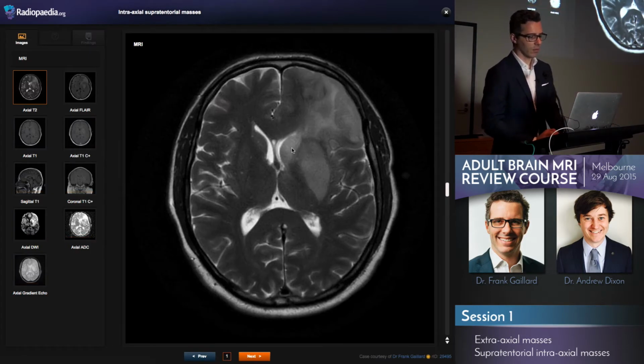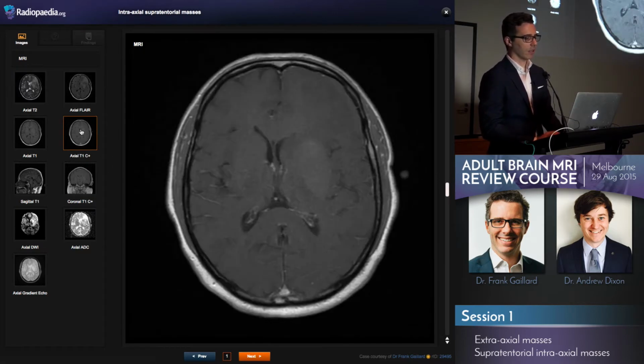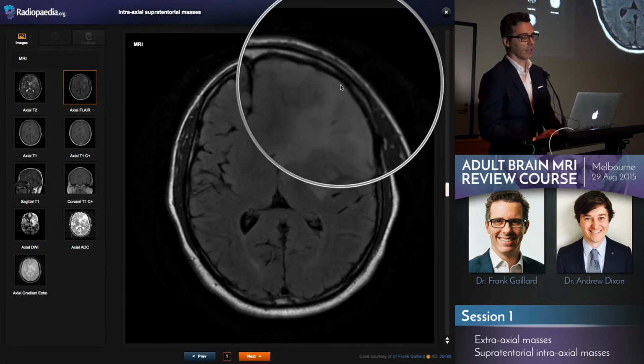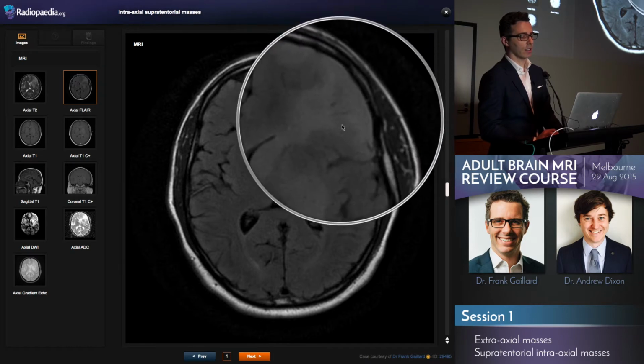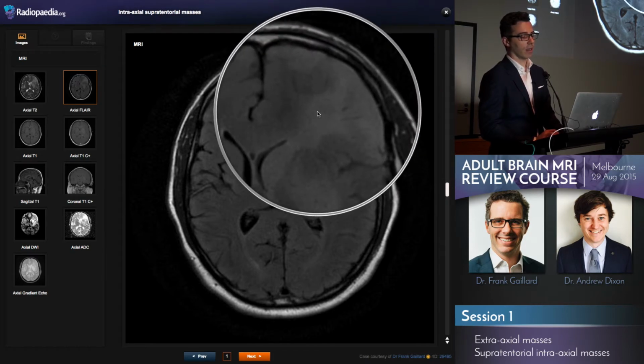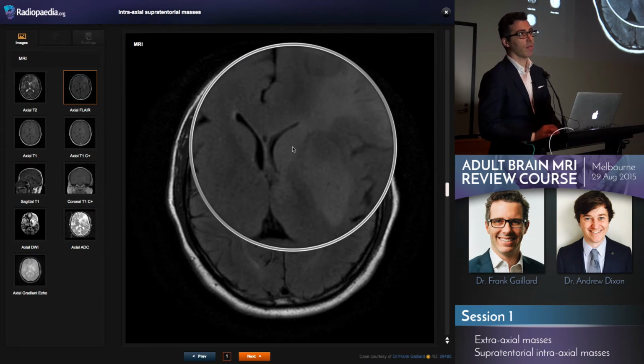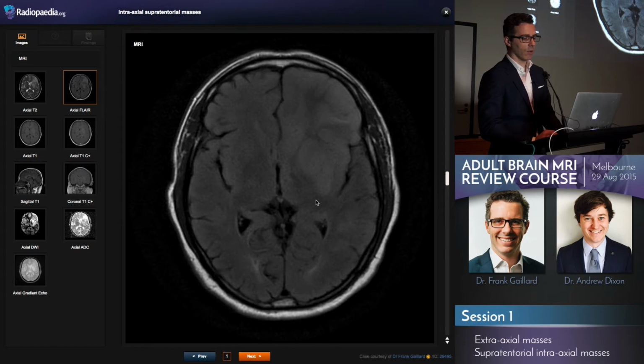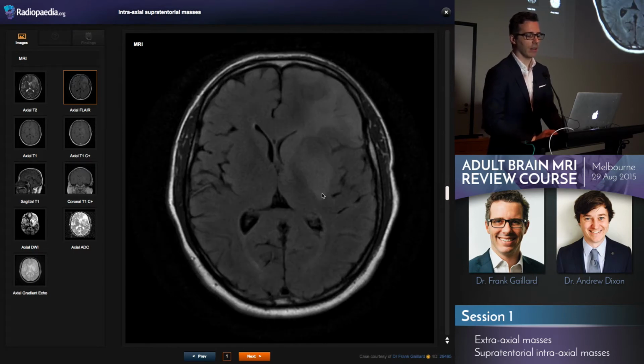So what do these look like? Well, let's look below the tumour. So this location, we don't have any enhancement, and we see a very similar appearance to the diffuse low-grade astrocytoma. We again see this thickening, non-enhancing cortex sign, if you want, with subjacent white matter involvement. Note the deep white grey matter is also involved, which is helpful because vasogenic edema tends to wash along white matter tracts but tends not to invade the much more densely compact deep grey matter structures, whereas astrocytomas have no such misgivings, with enlargement here of both the caudate head and the lentiform nucleus.